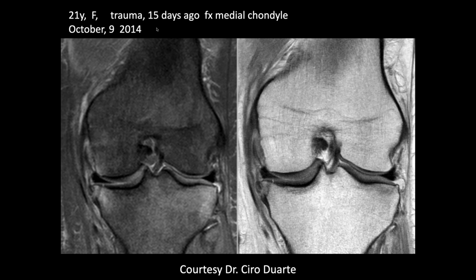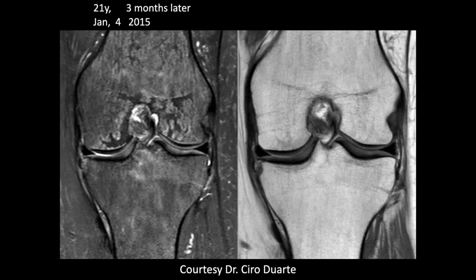Well, 15 days. Oh, 15 days. I see. I didn't read that. Pardon me. Forget everything I said. No, that's good. So it might have been more edema if it had been scanned earlier. That's a good point, John. And then that's just the marrow changes that you can see with disuse.